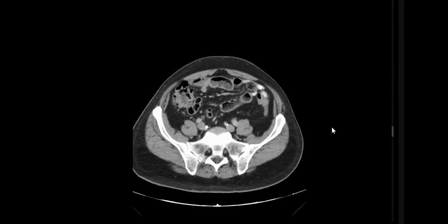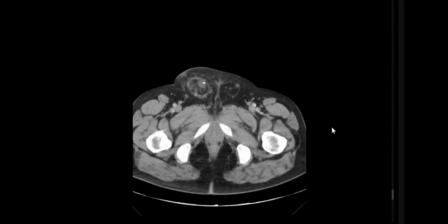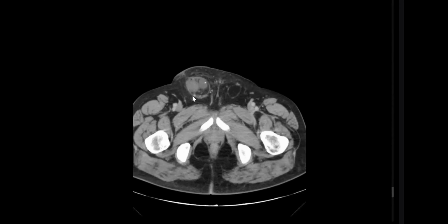Go down for the hernia. Go down, go down. Yes. What about this? Okay, let me help. I will take the control. Okay. I told you it's difficult.